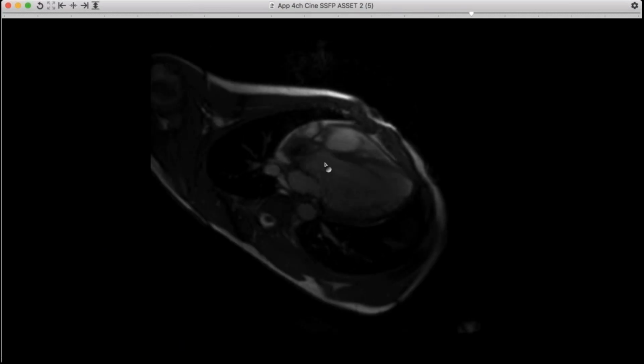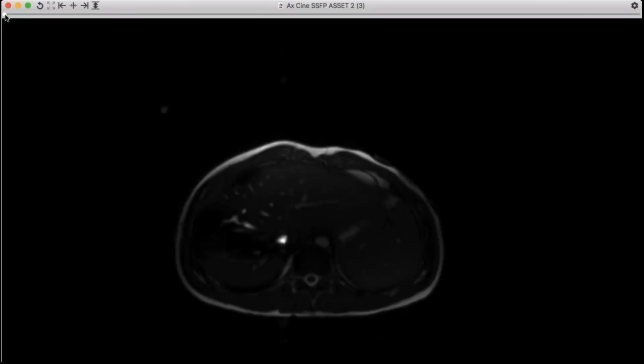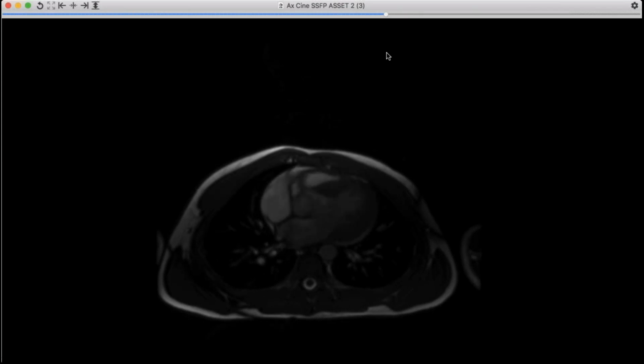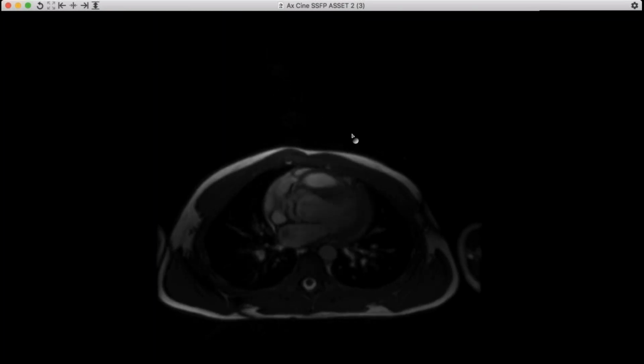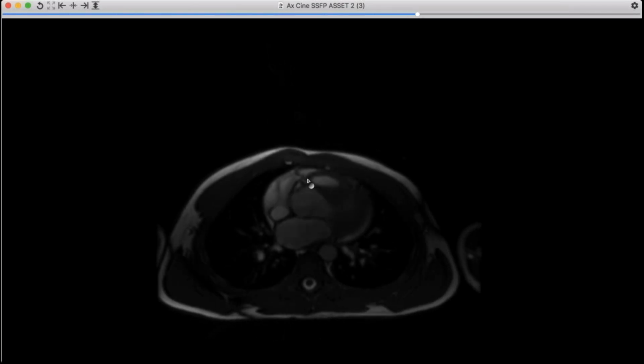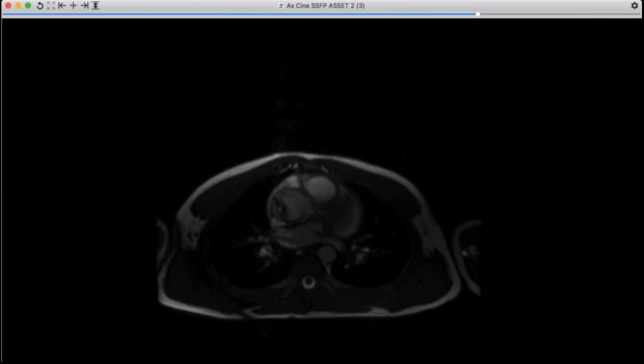So first of all, we can see there's the aortic valve, and it has this single, you don't see the leaflets really separating, and you can see turbulent flow to and from. So we have a regurgitant valve and some turbulence. And then on these are just the axial SSFPs. You can see right there only appears to be one real cusp to that aortic valve, and I'll go up a little bit as well. Again, this thickened, irregular cusp. You don't see a normal looking valve.